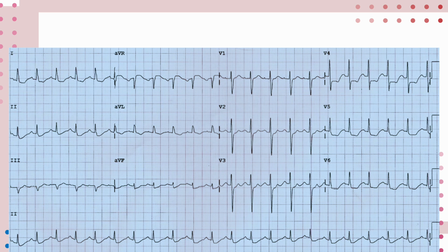Yes. So the next thing, under my eye, which is still my intervals, is ischemia. Now, are there features of ischemia here? And for ischemia, what did I say we check? We check ST elevation, ST depression, T wave inversion, and we check pathologic Q waves. There's definitely some sort of T wave inversion in my lead 2. There is ST depression in my V4, right? There's ST depression in my lead 2. Yes. So there's quite some ST depression, would you agree?